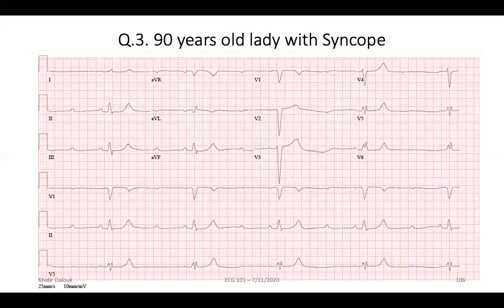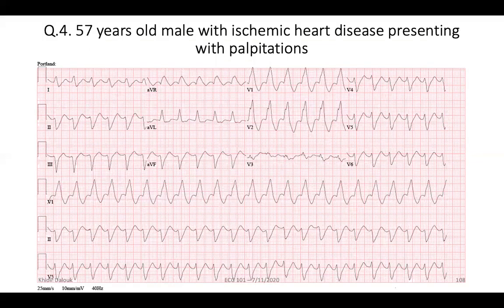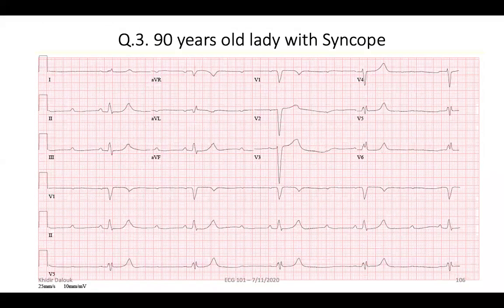Just to highlight one thing: commonly we see, as cardiologists, that the comment on the EKG will always be complete heart block, but we forget to comment on the atrial rhythm. Always the comment is on the escape rhythm, but the atrial rhythm is not mentioned. The proper way to do it usually, and Dr. Khidir can correct me, is to mention that the patient has complete heart block, but you also have to comment on the underlying atrial rhythm. Excellent point, Mazin.